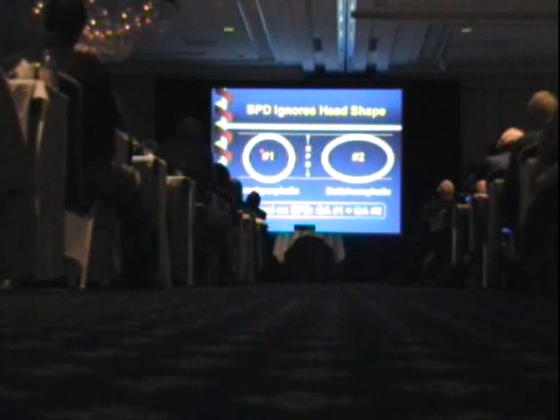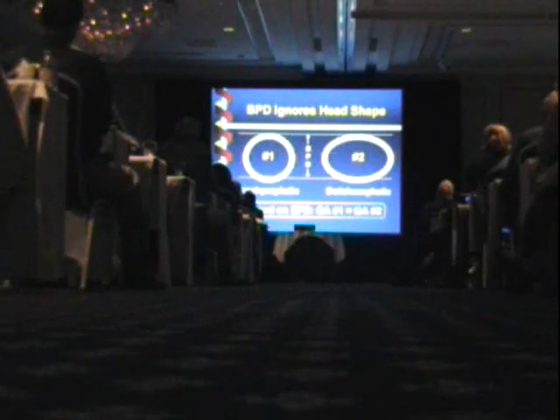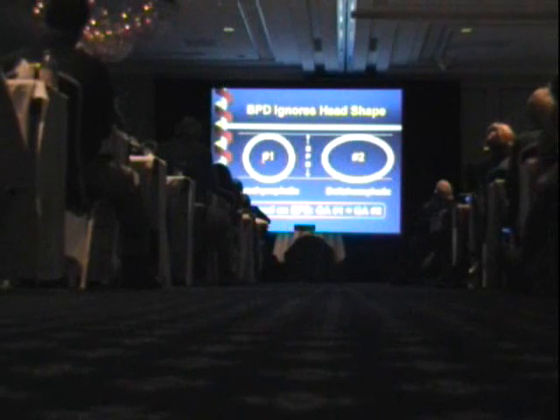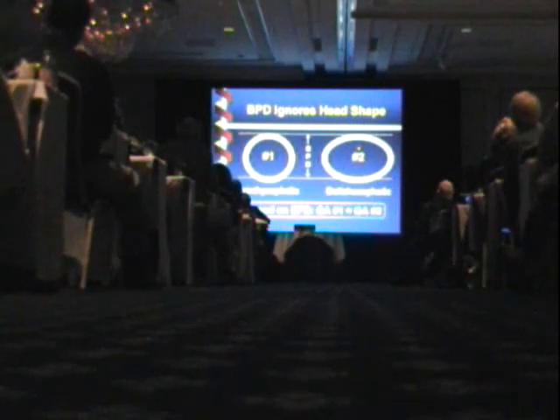Once you've taken your measurements, we use something called the corrected biparietal diameter, but it's equivalent to the head circumference. Notice if you have these two heads schematically, one is somewhat brachycephalic or short front to back, and one is a little more dolichocephalic, longer front to back. If you base the gestational age estimate on the biparietal diameter alone, you would give these fetuses the same age because they have the same BPD.